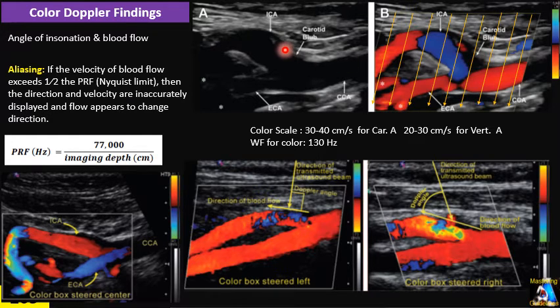As you can see here, how can we detect if maybe this is some pathology lesion, an anechoic lesion like plaque? Sometimes we have anechoic plaque that doesn't let it fill up, or no, it's because of the insonation that is perpendicular to that area or vortex flow that causes this defect and black area.